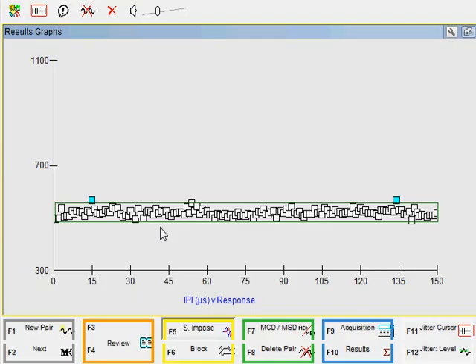So this is the first screening process in data analysis. Any data that fell outside the 3 standard deviations, you can see the blue squares over here and over here, are rejected automatically. The 3 standard deviations contain about 99% of the data. So out of 150, we expect to see 1 or 2 data points outside these limits, and this model fits perfectly. So I'm not concerned about rejecting 2 data points from analysis.